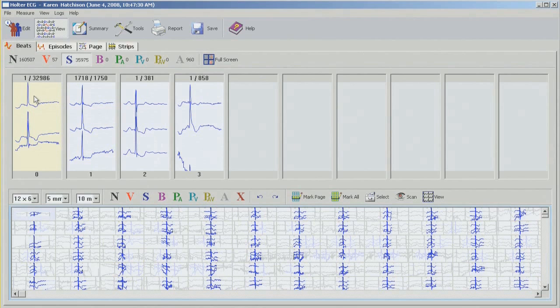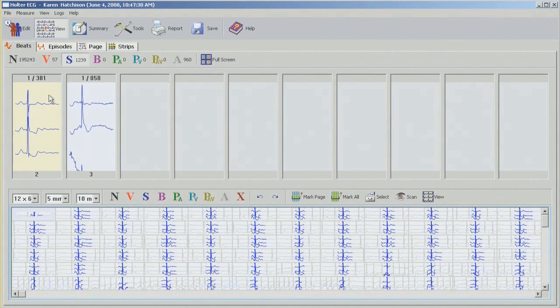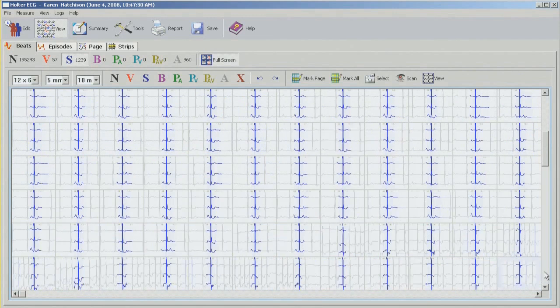While I'm in the bin, I right click and change to normal. Now the second bin as well, right click, change to normal. Now I'm going to look at bin number 3. You can see the view button and go into the bin.